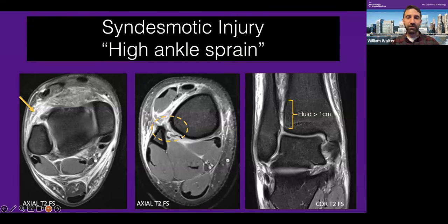You're seeing a few fragments of the ligament or membrane here, and there's just edema all throughout this area around the syndesmosis. There's fluid filling the superior syndesmotic recess here. There's a normal recess of the tibiotalar joint in this location, but it only extends approximately 1 centimeter above the talar dome. And so if you see fluid extending up into the syndesmosis beyond that centimeter height, this indicates that there's disruption of the ligaments that normally delimit that part of the joint recess.